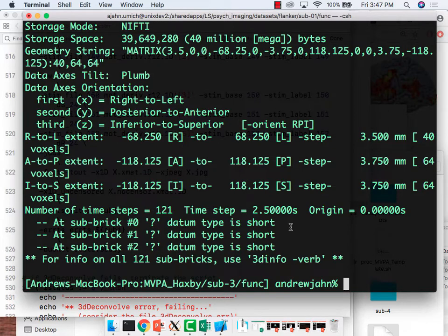Okay, a little snag here. I'm actually glad we caught this. If we try to regress the motion derivatives, we're going to have too many regressors, right? We only have as many degrees of freedom as we do time points. So within a run, if we now have 150 regressors, it's going to fail. Sorry about that. Could you regress just the motion?